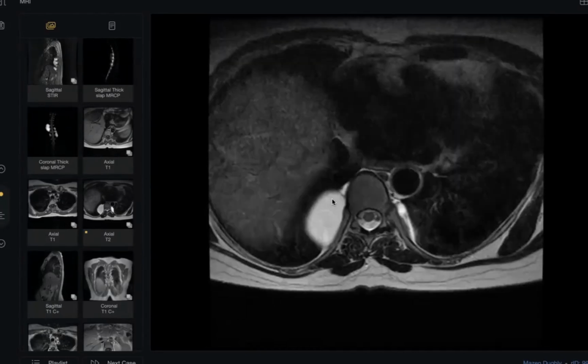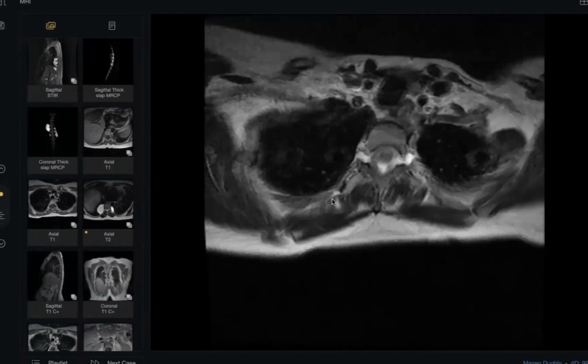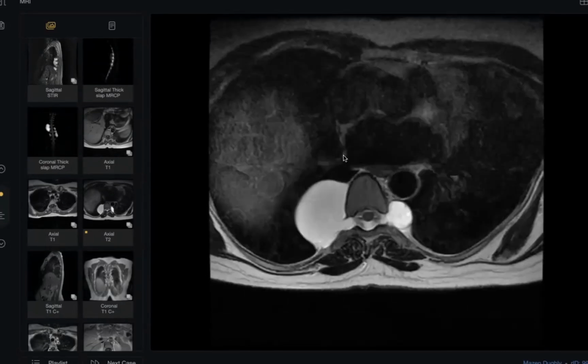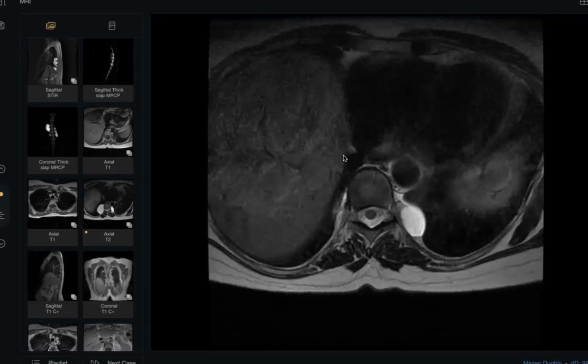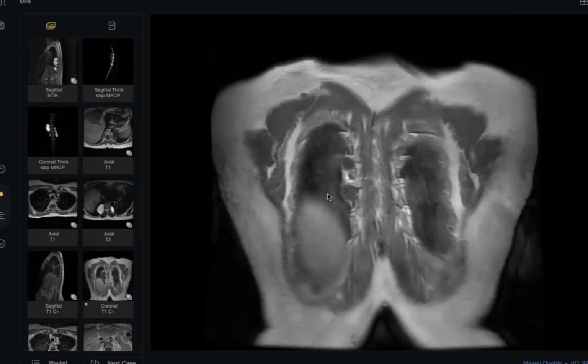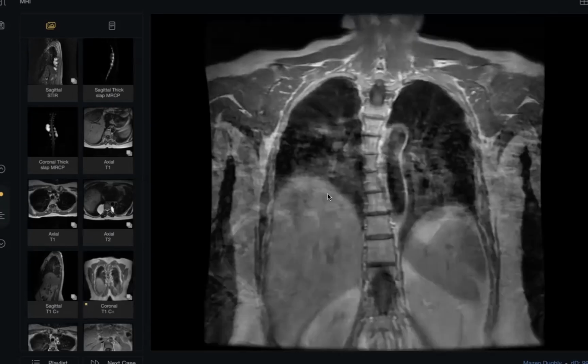Yes, these are lateral meningoceles, pathognomonic or diagnostic. No other associations could be identified in this MRI of the chest. Regarding the adrenals, looking for pheochromocytomas, I couldn't appreciate any adrenal lesions on either side.